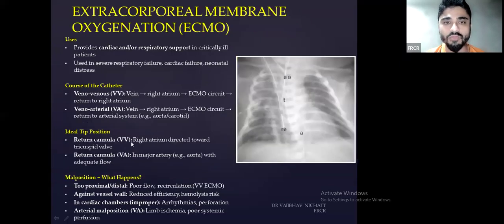Now coming to ECMO. So extracorporeal membrane oxygenation. So what is ECMO? Sometimes you might see two tubes.